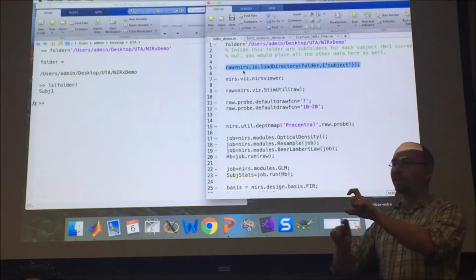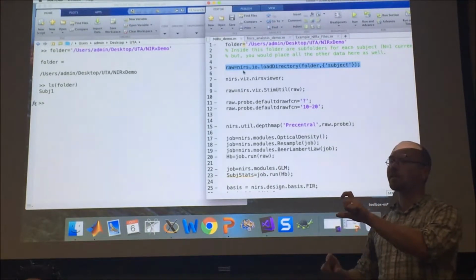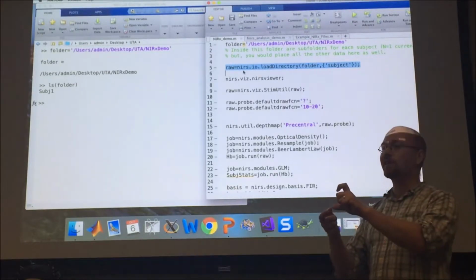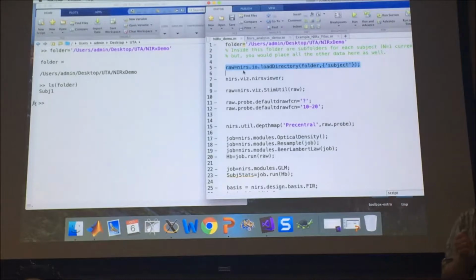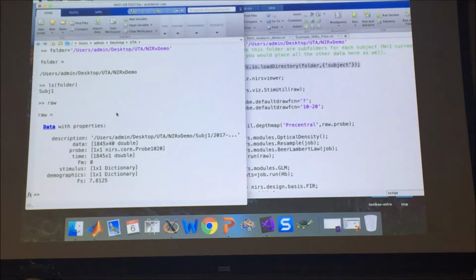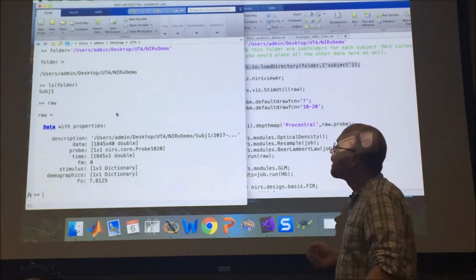There's a way to bypass that if you did, in fact, use different montages. But that loading takes, on my computer, like 30 seconds, so I'm going to bypass that and just go straight to the fact that I already loaded the data before I started talking. Of course, I also wasted 30 seconds explaining that I loaded the data before I started talking.